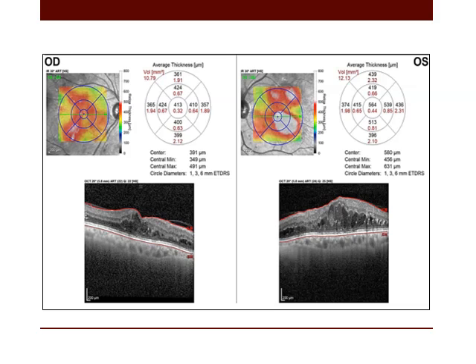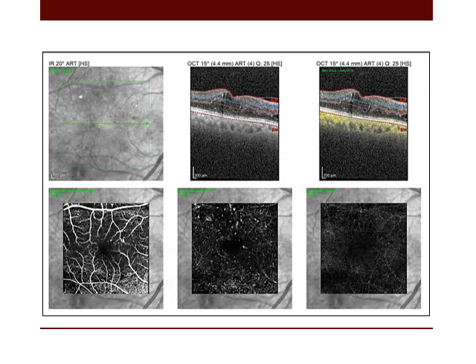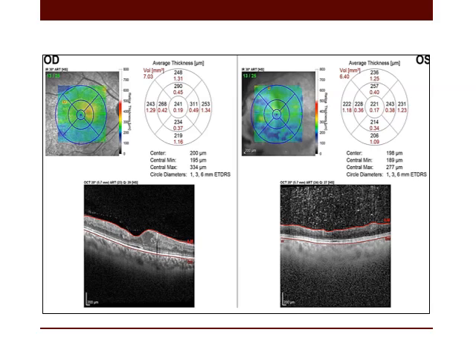A patient with central involving cystic thickening in both eyes. If we see OCT angiography, we can see the cysts as black hyporeflective areas with white dots in both superficial and deep capillary plexuses. These dots are the microaneurysms with motion enough to be detected by the device.